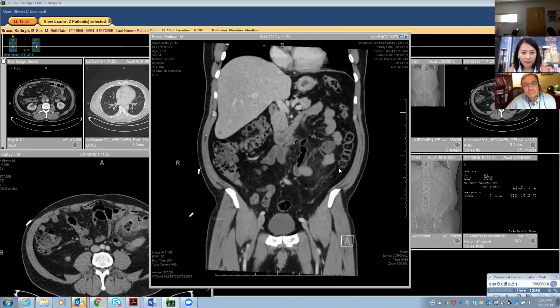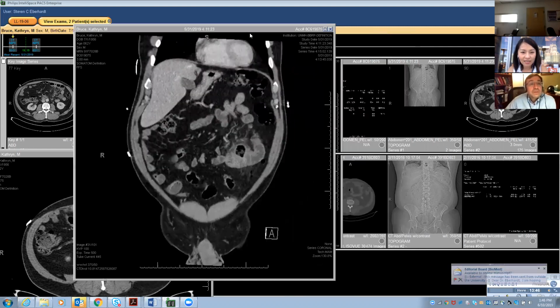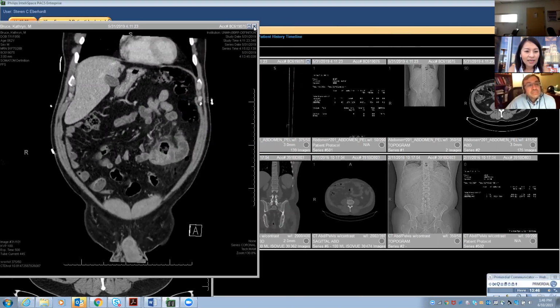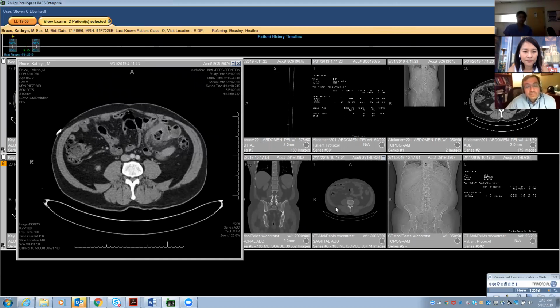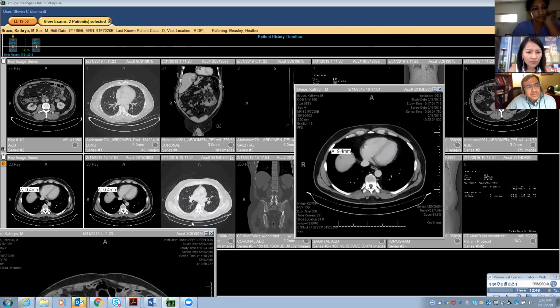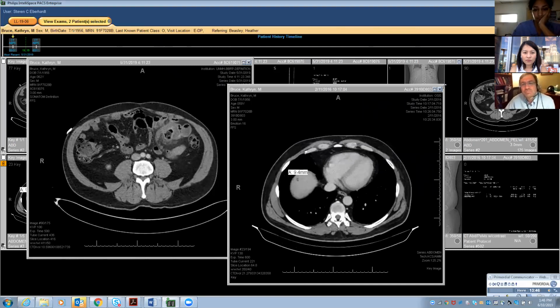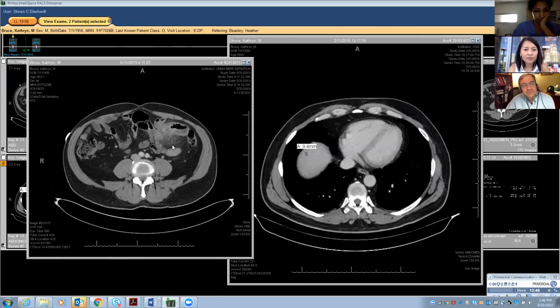We can think about a diverticulum that's become super infected and developed an abscess. Right. Whatever is infectious inflammatory, there's a lot of stranding, and I think that we have to follow it up to make sure there's not an underlying small bowel adenocarcinoma or malignancy. Okay. So remember, one other thing that differentiates is what Artie had showed us in a prior session, where there were small bowel perforations from foreign bodies. Oh, right. The fish bone. But there's not a visible foreign body here. It's just an inflammatory process.